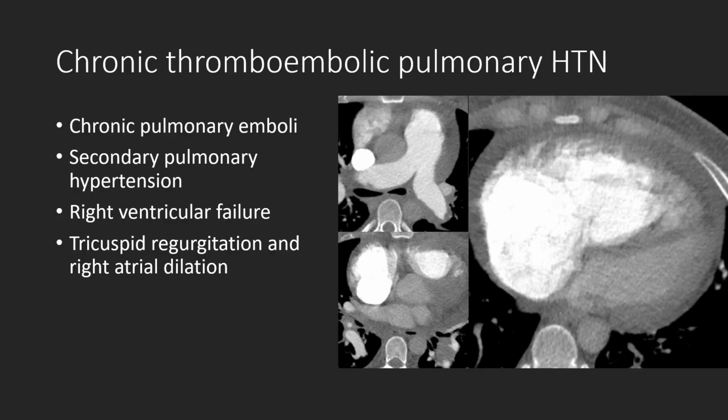This is a case of chronic thromboembolic related pulmonary hypertension, also known as CTEPH, that resulted in right heart dilation and dysfunction. CT images on the left, following contrast, demonstrate an enlarged pulmonary artery shaded in blue, eccentric filling defects shaded in green, representing chronic pulmonary emboli. This led to pulmonary hypertension and eventually from long-standing elevated pressures, right ventricular hypertrophy, and enlargement.